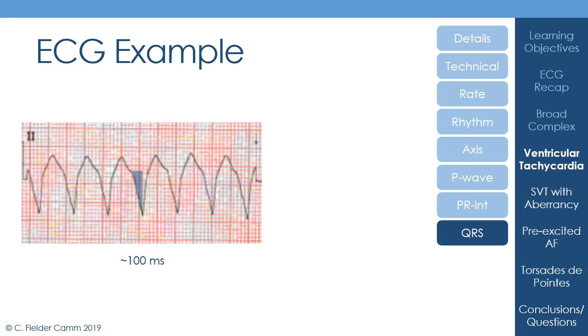you remember that actually the first bit of the QRS complex in bundle branch block is normally quite quick. That's the bit going down the bundle that's not blocked. So in right bundle branch block, it's the bit that's going down that left bundle. And the bit that's broad is the bit where it's trying to get through the ventricular muscle at the end. So you have a sort of pretty narrow bit and then it gets broader. And that's particularly the case when you're looking at that slurred S wave in V6 of right bundle branch block.